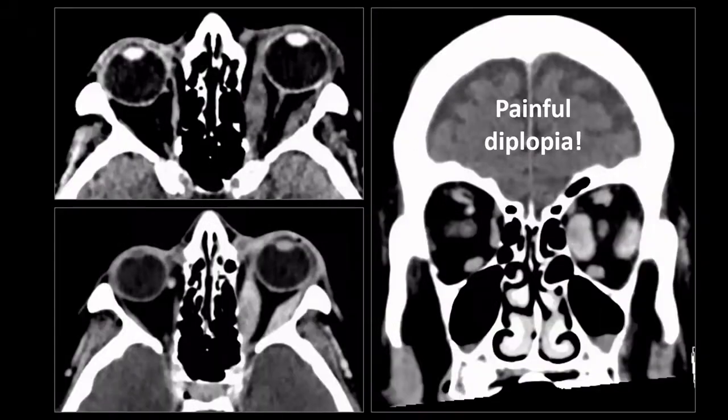And let's look at something that looks a bit similar but is not thyroid eye disease. This is a patient with a proptosis of the left eye. So it's a grade 1 proptosis. So the posterior sclera is still located underneath the interzygomatic line. And we see that there is enhancement and thickening of these two muscle bellies, namely the medial and the lateral rectus muscle, as you can see here.